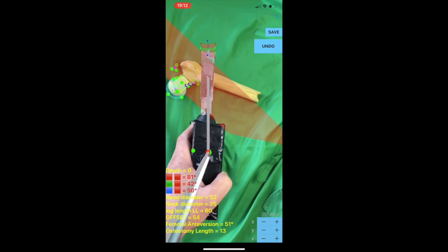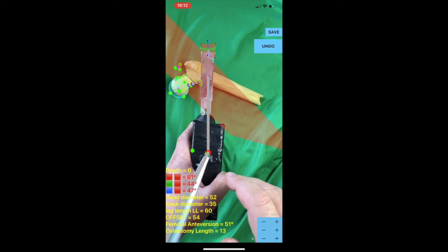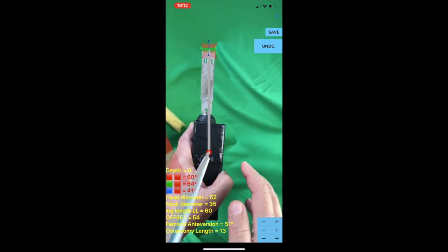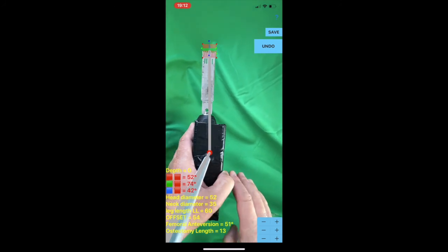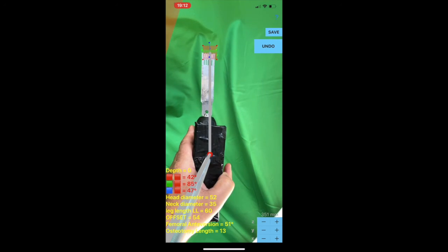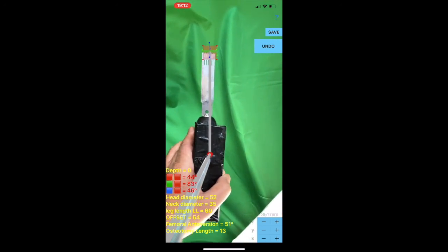Also, by pressing the plus or minus button, the length between the tip pointer of the iPhone case probe at the bone saw cutting machine orthopaedic power tool and the tip of the center of blade can be adjusted accordingly and calibrated for every osteotome. Now the surgeon can obtain positional information in real time in augmented reality of the blade saw and the direction of the intended bone cut at femoral neck.